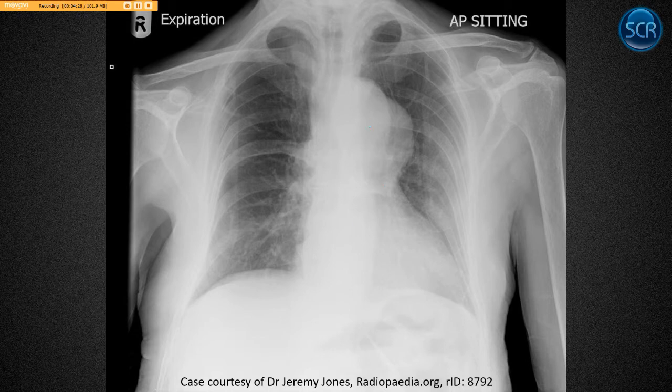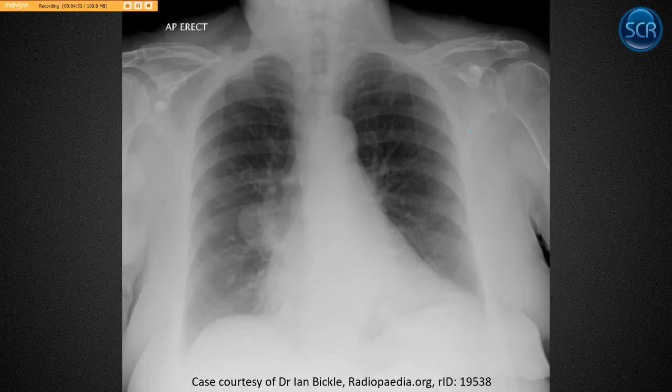Here's an example of someone with a mediastinal mass, and so you can see that we should see our aortic arch. We should maybe see a little bump for the left atrium, left ventricle. This is all extra. Okay, our hila come out here. We can maybe see some vessels, but this is a mass. So this person has a bronchogenic carcinoma, most likely. Could be lymphoma, could be a number of other things, but nothing good is going to show up as a hilar mass in most instances.